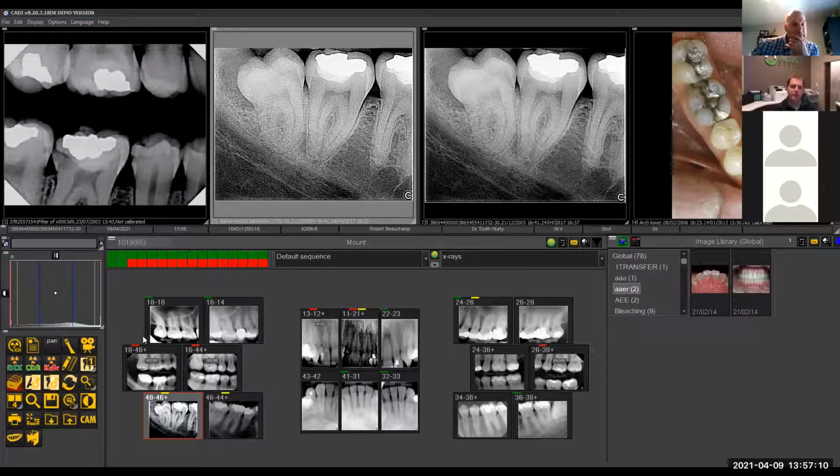There's a little C in the bottom right-hand corner. Does that mean anything on the window? Yeah, right there. That means this was taken in software that we OEM'd, or made for a distributor up here, so it had a different name. It had a stamp with the letter C for their name. You're not going to have that. This is more of a private label type thing.